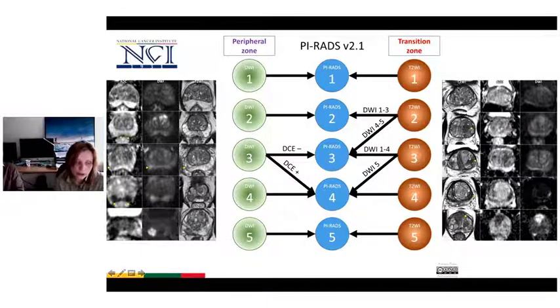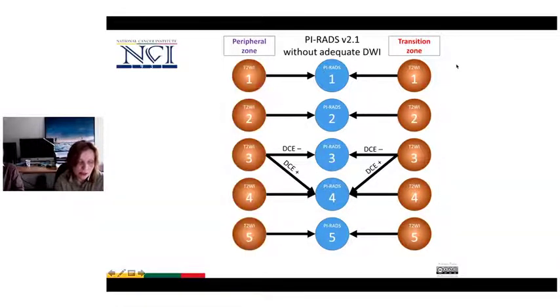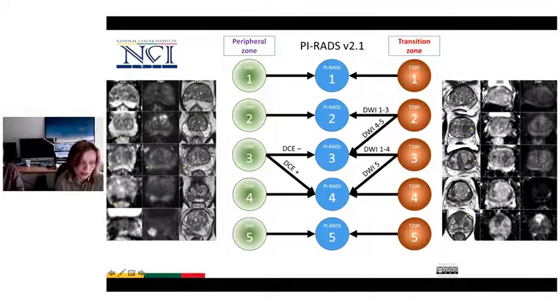We are looking at T2 images, the anatomical ones, and for help we are using, of course, diffusion images. So if we don't see any lesion, it's 1. If we see a nodule, remember about the capsule. If it has a clear capsule, sometimes it could even be 1. But if we have a very, very dark nodule, it's 2. And if we have a not fully encapsulated nodule and it has some drop in ADC or some bright signal on diffusion, then it could be 3.